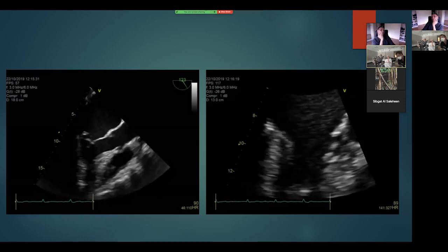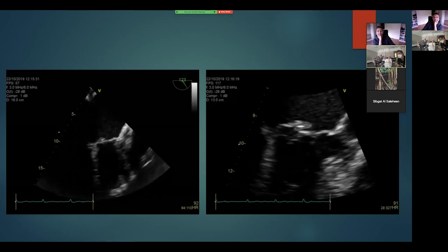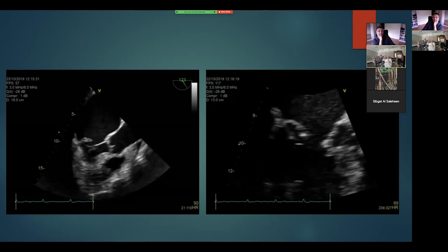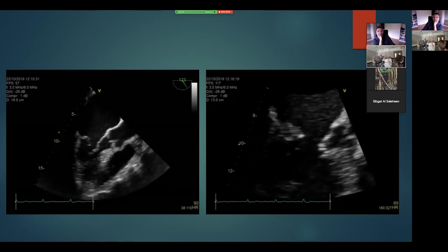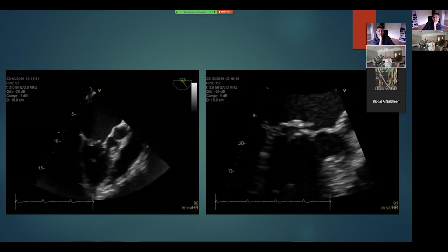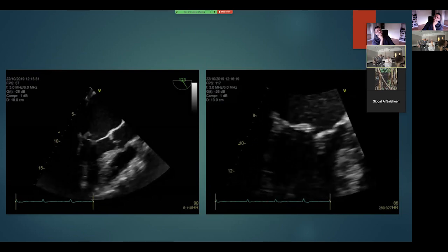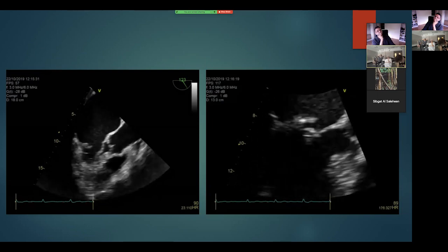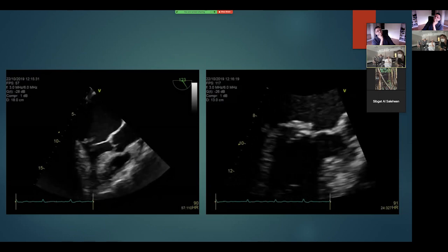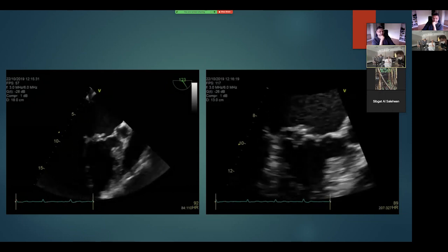This looks like a 3-chamber view. Is that right? Yeah. So, okay, the aortic valve is there, so that'll be anterior. The anterior leaflet looks okay. And the posterior leaflet again looks like it's pointing into the atrium there. I can't remember, I'm presuming that's the same as the 3-chamber for the transthoracic. That's correct. So that would be P2.